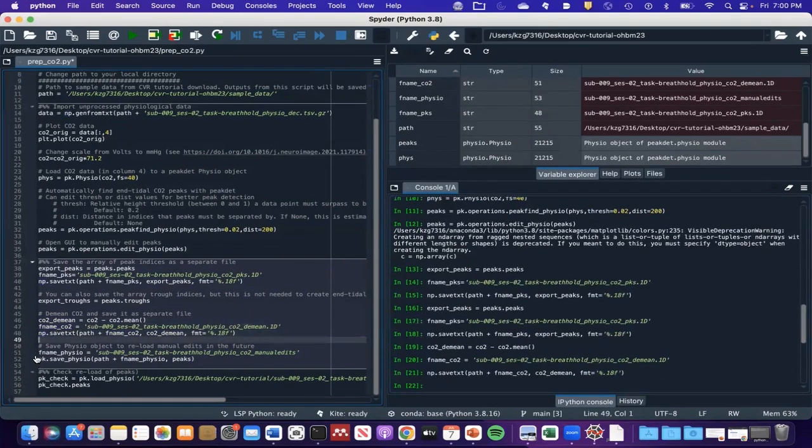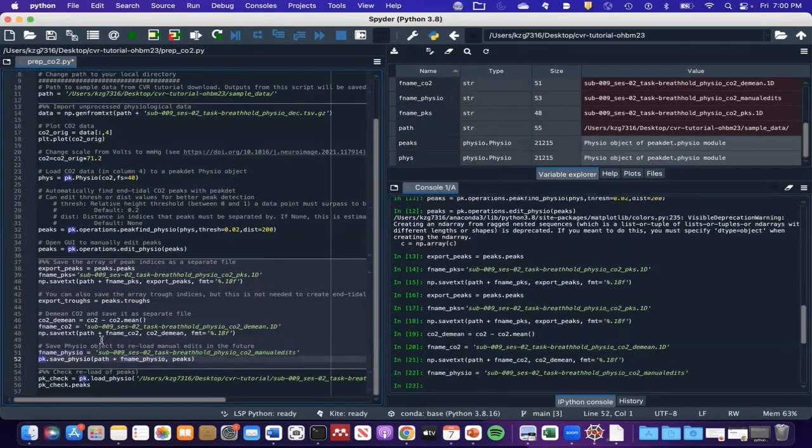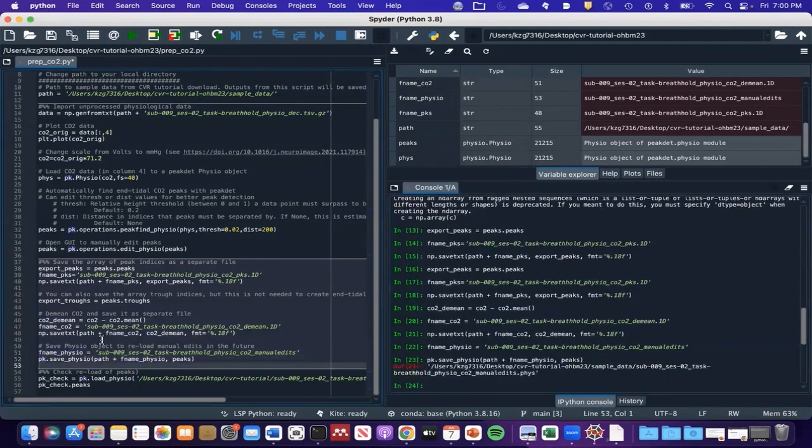So this lists all of the different input options, and you can see actually if we type phys2CVR -h, it will give a more detailed description of what all of those inputs are, starting here, and it will tell you also which arguments are required and which are optional.